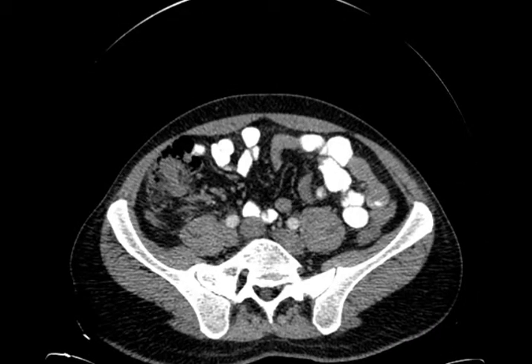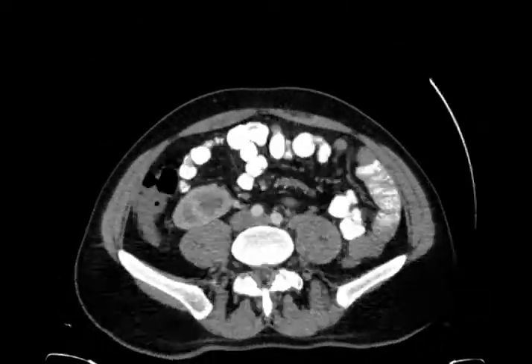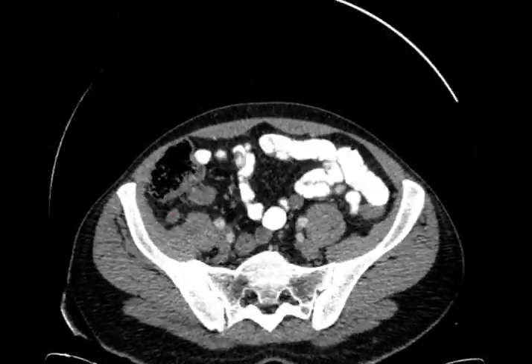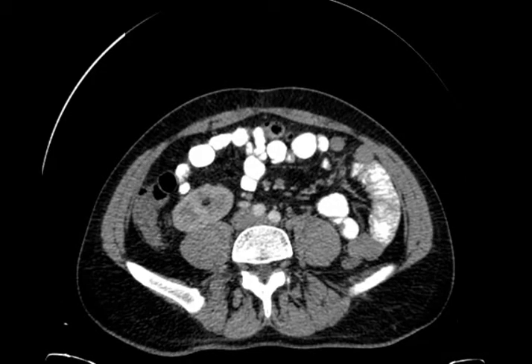Why was the ultrasound normal? It's a retrocecal position. So that's why it could not be seen by ultrasound. We can change the position of the patient. Sure, but lateral, in this case it did not work. We tried everything, we could not see it. So CT was recommended and it showed evidence of appendicitis.